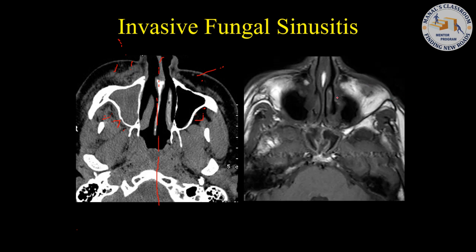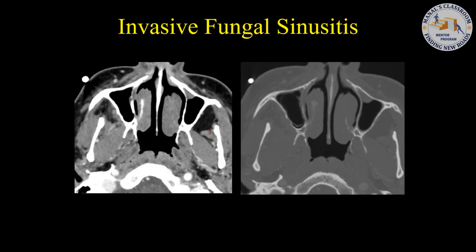Because if you continue, and this is another example here, another example of invasive fungal sinusitis. See how it's involving the pterygopalatine fossa? See the normal fat on the opposite side? That's the earliest findings. Another example here, lots of increased attenuation here compared to the opposite side. See the subtle abnormality here on the right side compared to the left.